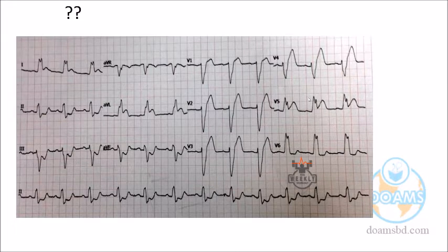Yes, there is an M shape in lead one. I'm not asking about lead one, doctor. Just be busy with the chest leads. There are additional features in V1 and V5 or V6. You can compare here. Yes, we have the deep S here, but to identify the typical features of wide QRS, we have an M shape in V5 and V6.